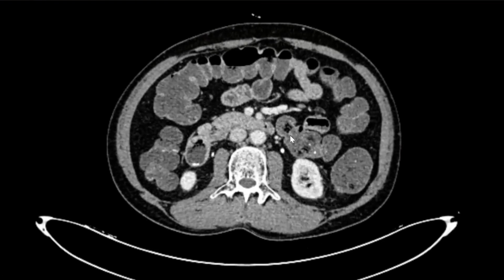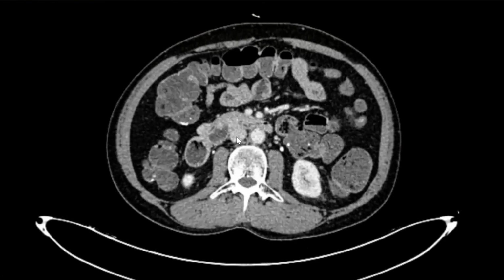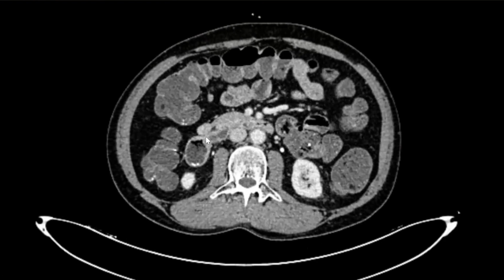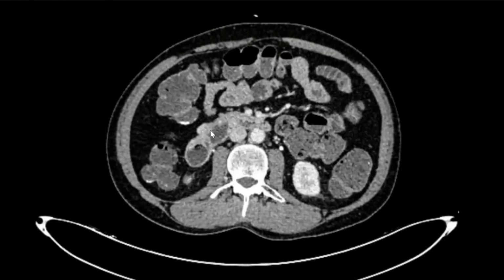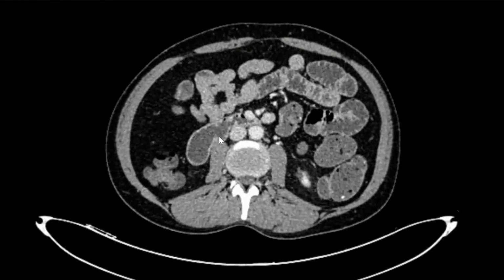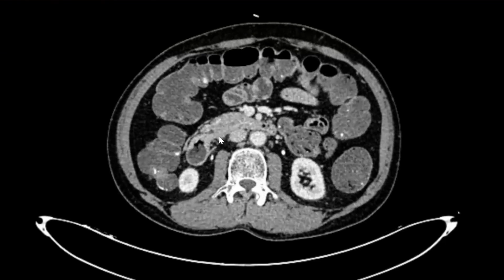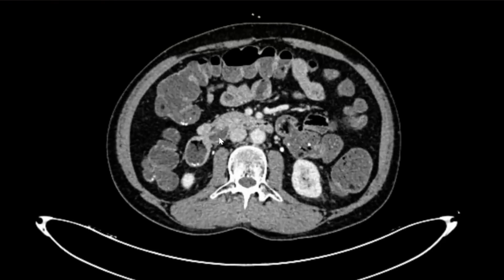Okay, so I've been given the portovenous phase. As I'm saying, the lesion, the observation shows enhancement the same as the portal vein, so it confirms my finding of aneurysm. Okay.